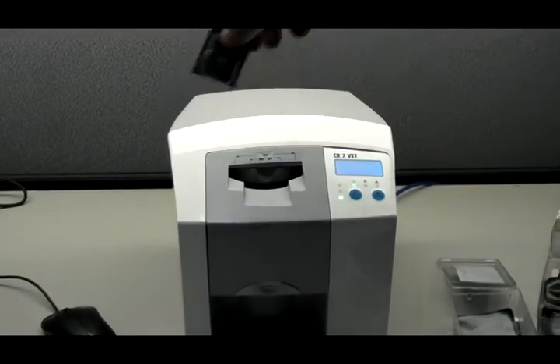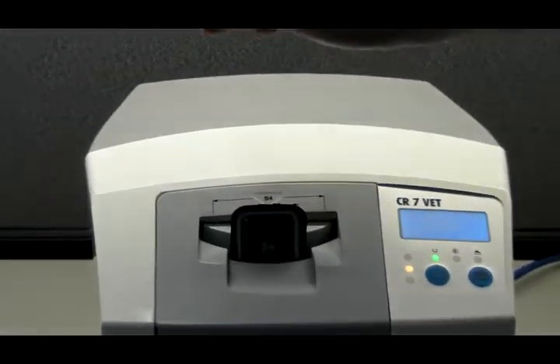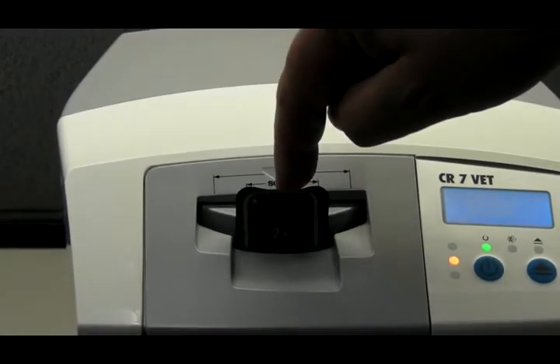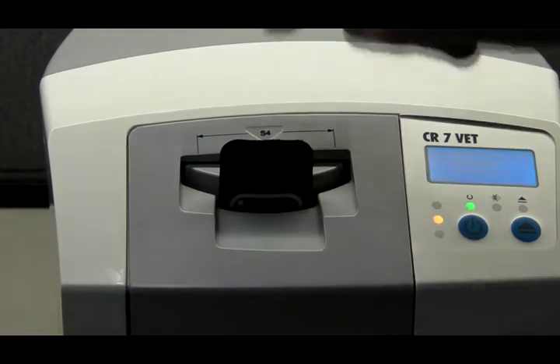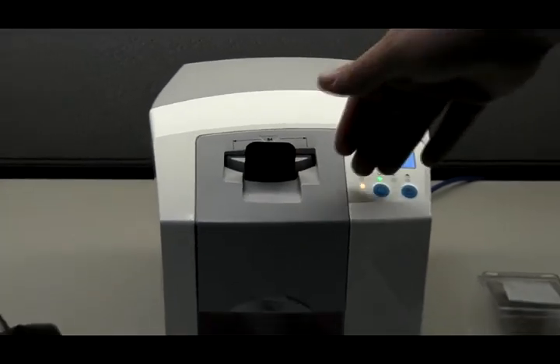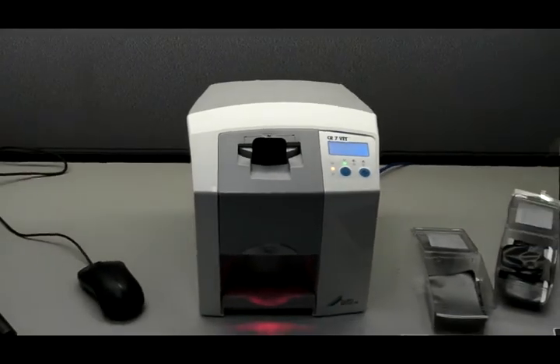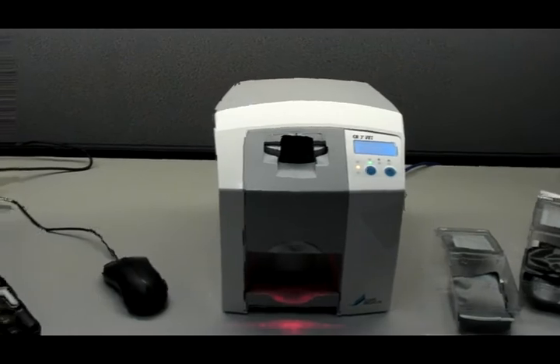The plate then gets placed in the scanner, and using one finger, press the plate into the scanner until you feel it move. You'll see an amber light to say that it's going through, and on the actual computer you'll see a preview coming through.